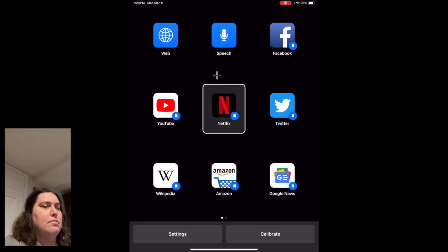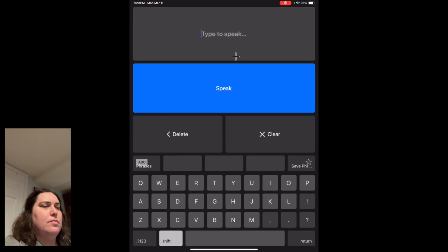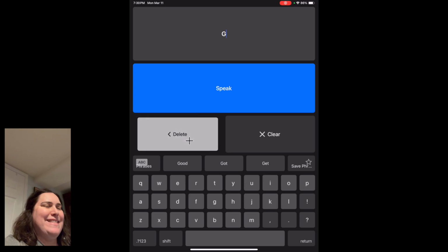Now that we're done with the calibration, we have different apps we can choose from. Here you'll see me make a smile for selection. However, when I'm trying to use this, it changes the focus of the target when I smile. I'm having a hard time getting the right spot.